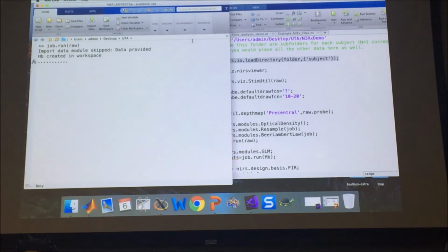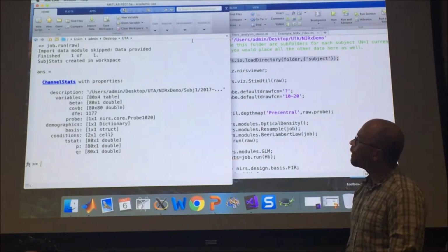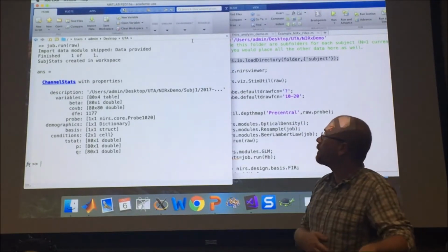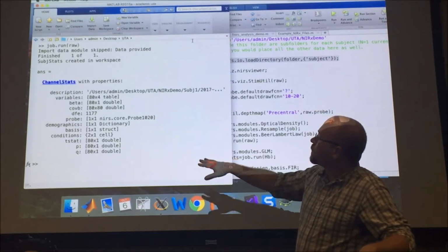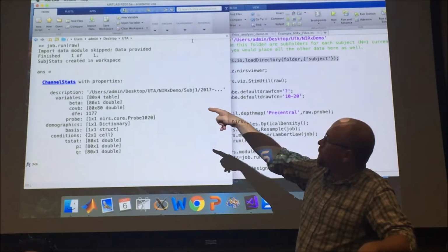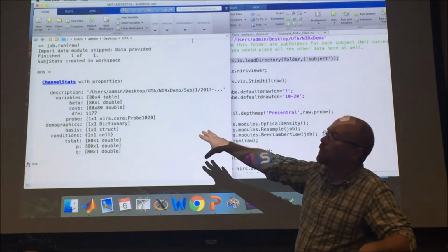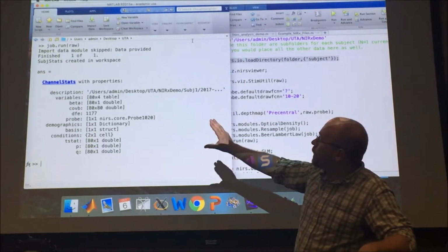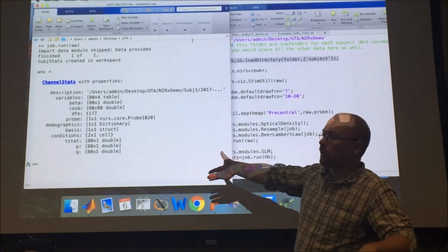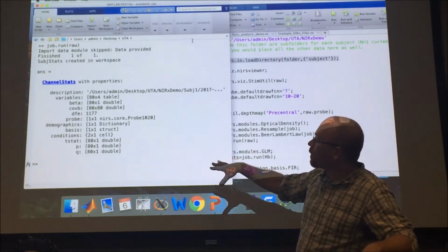What that's going to do, you see it's already on the hemoglobin, it already ran the Beer-Lambert law, and it was running the stats when it was going dot, dot, dot, processing that iterative stats. It returned and saved the data as subject stats, created on the workspace, and now this is what was actually saved in that model. Just like the raw data structure, this is an object that my toolbox has custom written, and this is where all the stats get stored.